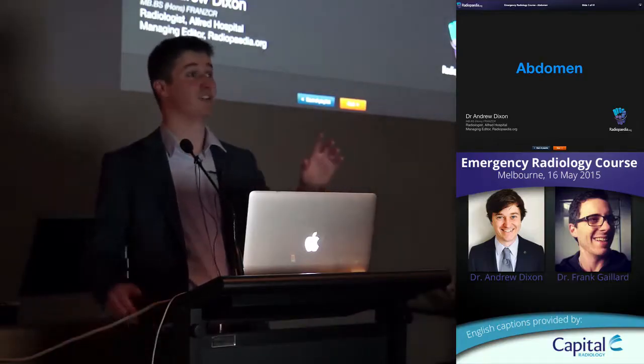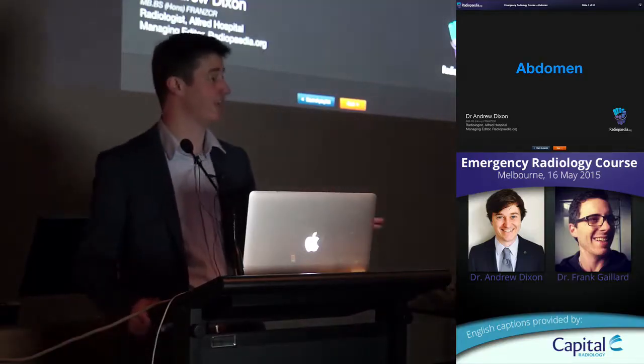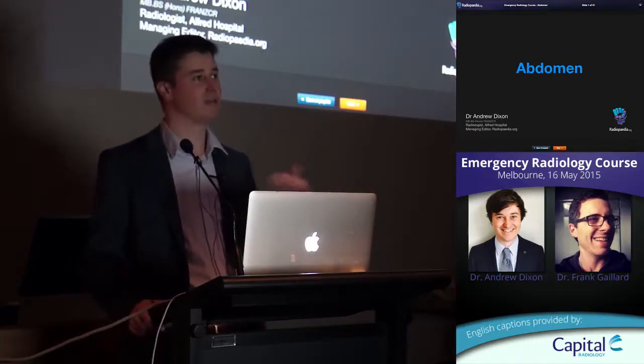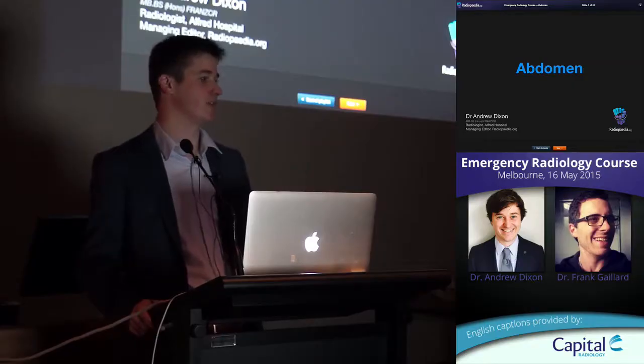So you might feel like you're getting a little bit dizzy as I'm scrolling down and pointing out the things, but I'm just trying to get through the important findings and pathology, and then you can take your own time to work your way through every image.